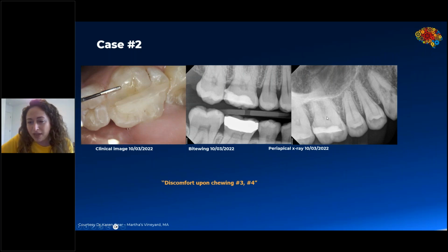So this is the bite wing and periapical x-ray we have. The first thing I looked at was this root resorption on number 6. So before knowing the clinical symptoms, I actually thought that this was the reason why they took the scan, but it was just an incidental finding. If we look at this periapical x-ray, we might be able to see PDL space widening around number 4, but it's not something concrete. It's not something we can absolutely decide that this is fractured, let me go and extract the tooth. Whereas number 3, we can't really see any change around the PDL space.